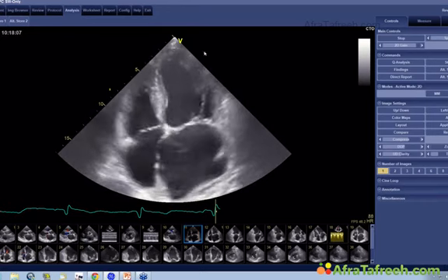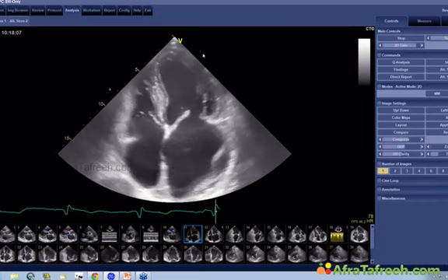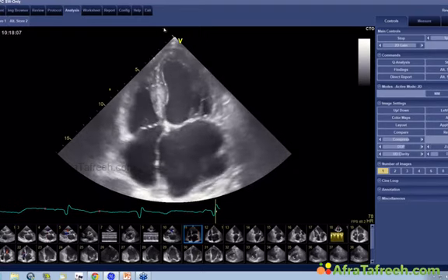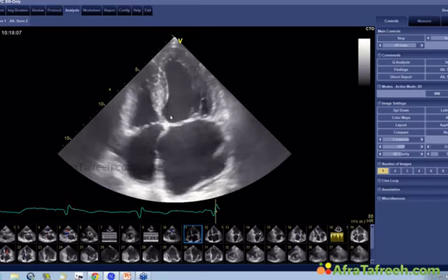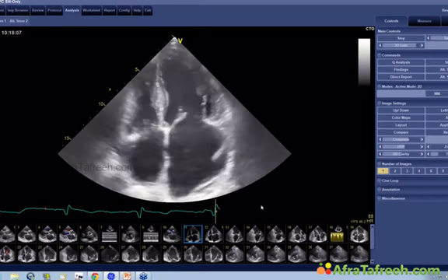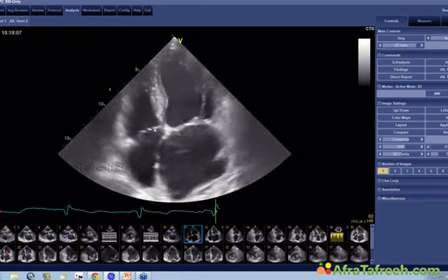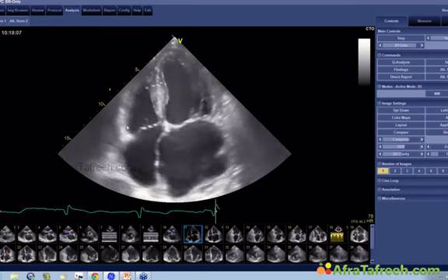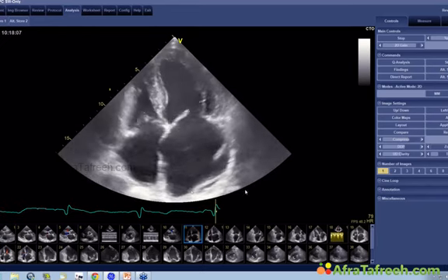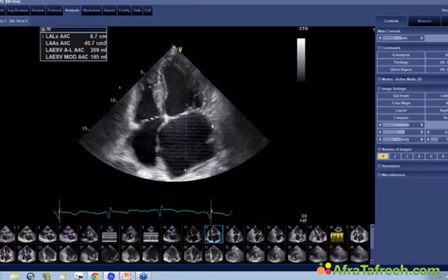Then I look at the texture of the myocardium, which looks kind of echodense. Okay, now you might say she has amyloidosis. Could be in an old senile patient. There are senile forms of amyloidosis, okay? And then we see that right ventricular function is also not normal, and that the left atrium is significantly enlarged, and then you usually calculate the volume of the left atrium, in this case 209 milliliters, which is very large.